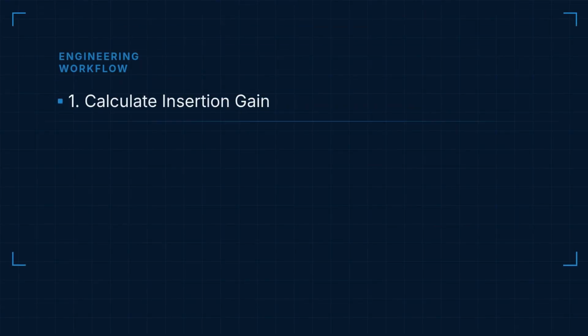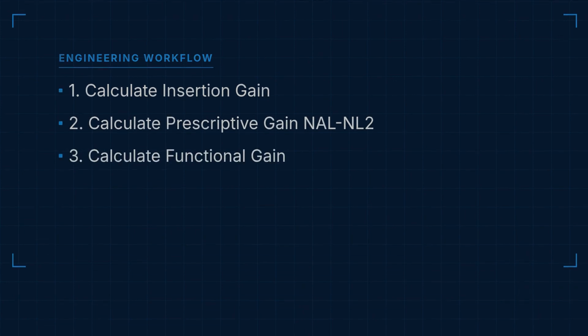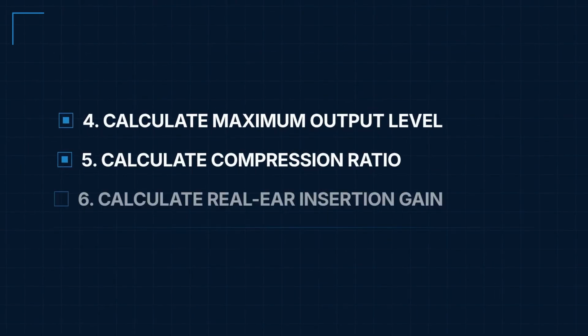Calculate Insertion Gain, Calculate Prescriptive Gain, NAL-NL2, Calculate Functional Gain, Calculate Maximum Output Level, Calculate Compression Ratio, or Calculate Real Ear Insertion Gain. For this demonstration, I'm using Calculate Insertion Gain.